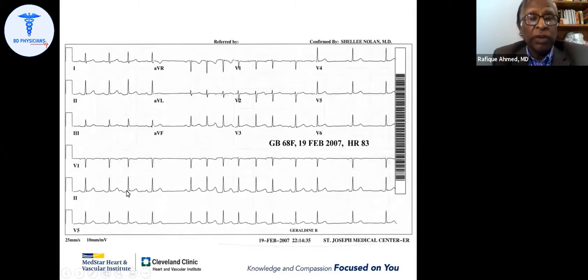So this is another patient. You can see a P wave and then a bunch of QRS complexes. We don't know what they are. But when you see something you can't read, you just leave that and go for places where you can see things. What I know is that P wave QRS, P wave QRS is sinus. So here I can see something, and I think this is a short run of atrial tachycardia.